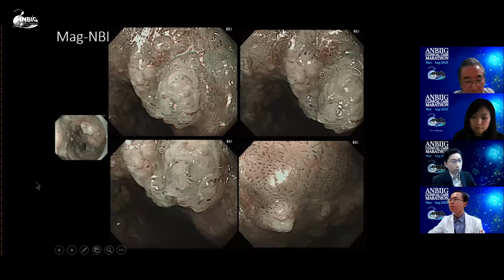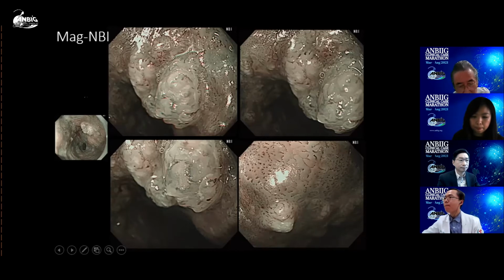Yes, so we can see an AVA in the center of this image, surrounded with brownish small vessels. And behind, we can see a green, relatively large vessel.